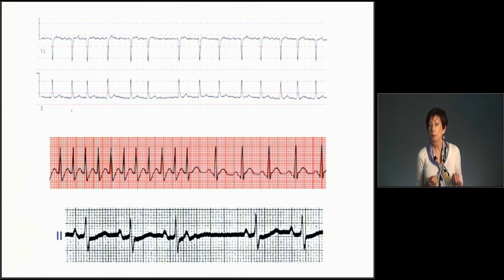I would say it's probably atrial because the rate's pretty fast, compared to a junctional tachycardia. But really, when you can't identify clear-cut P waves, then you have to say it's SVT. There's nothing wrong with saying it's SVT. It's SVT because the QRSs are narrow. If the QRSs are wide, then it's ventricular tachycardia.